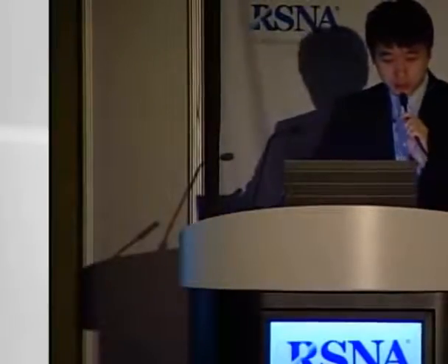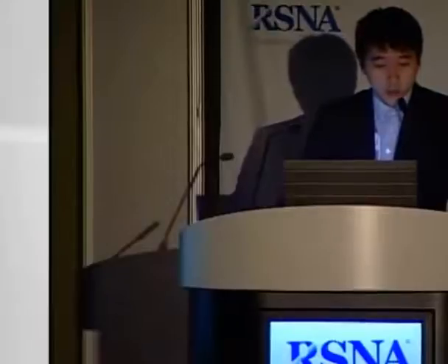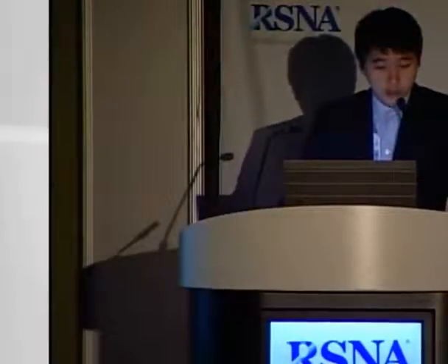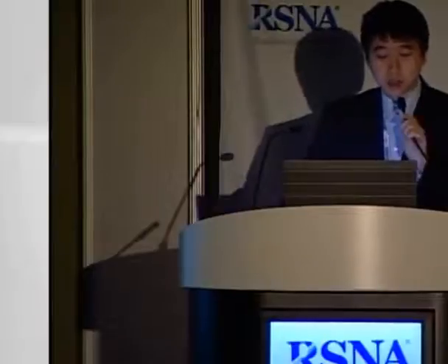Thank you, Chairperson. I'm Jae-young Cho from Aju University Hospital, South Korea. I'd like to present a feasibility study of low-dose chest CT for initial evaluation of blunt chest trauma patients. As we know, computed tomography is the most important diagnostic modality in the emergency department due to its effectiveness in traumatic and non-traumatic conditions. Especially chest MDCT is accepted as an effective and fast imaging tool in severely injured traumatic patients.